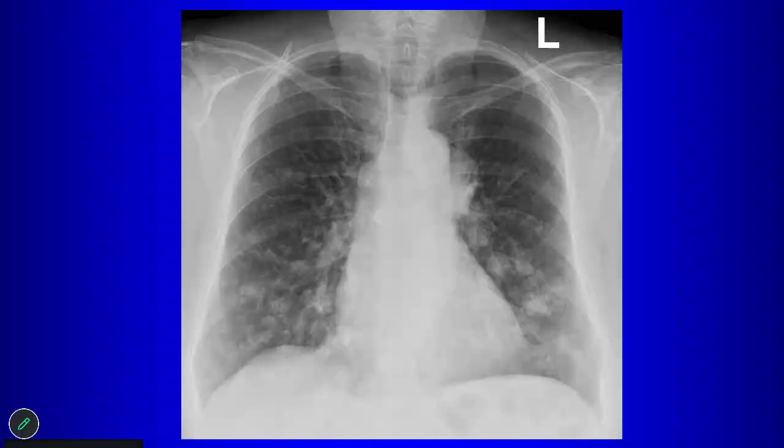So now on this chest radiograph, what are we concerned about? What bothers us? Consolidation, opacity, what? Given that we just covered the AP window, what are you concerned about here? Probably fluid overload. What is this thing? There's a big mass here in the aortopulmonary window. Okay, so most common, so you're concerned then about what?